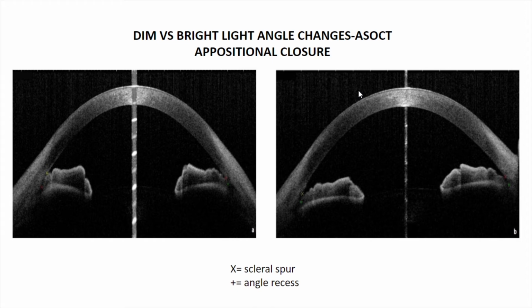of the reasons it acts like a sponge in nature, and the fluid is not let out of the iris. So that tends to bunch up in the periphery and cause closed angle. So that is one of the theories put forward. Okay, so that's something which you should know: iris volume. What happens to it in closed angles? Next, that's what you're seeing with the dim light and bright light here.